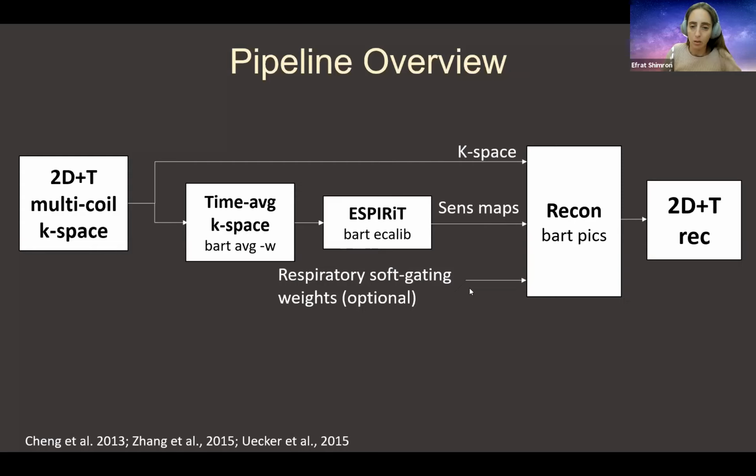There are also some other optional inputs. I will refer to that later. So let's go into the first step, which is the pre-processing step.